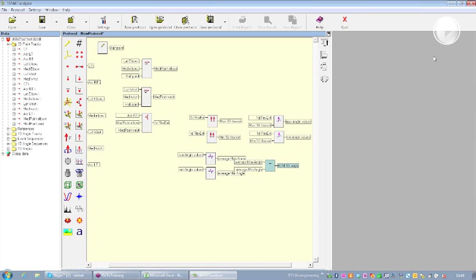Now, we have the maximum events. The maximum events, as I told you, are the events corresponding to the maximum extension. So from one extension to another extension, I have a cyclic movement, okay? Because I start from an extended position and I go back to the extended position. So, for example, I can see what happened to my angle during this cycle between one extension and the next one.